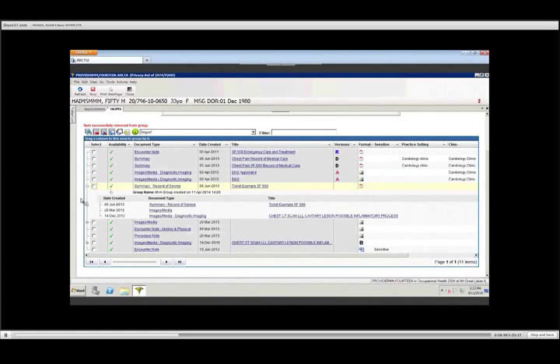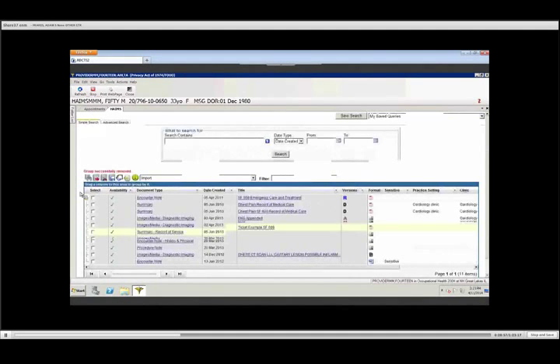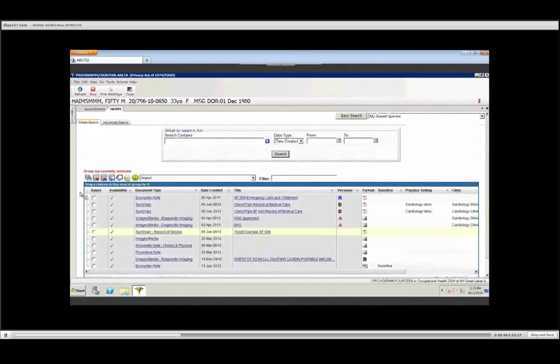So if over time you decide that you no longer need this group, you can delete it simply by right-clicking on the group name and just deleting the group. Keep in mind that when an asset has been uploaded into the HAIMS application, you can never delete the asset itself. It will be in the record forever. So this grouping and ungrouping does not delete anything. It just ungroups whatever was grouped.